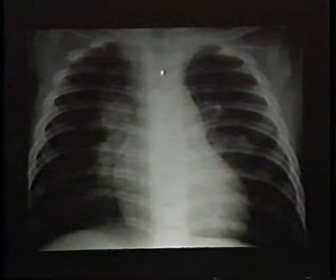Most patients present with respiratory infections, as illustrated here. On the regular chest film, it may be difficult to identify that the trachea is deviated to the left, identifying the right aortic arch. This is our high kilovoltage film of the airway, as we've described, and I think easily you can identify the right aortic arch displacing the trachea to the left.